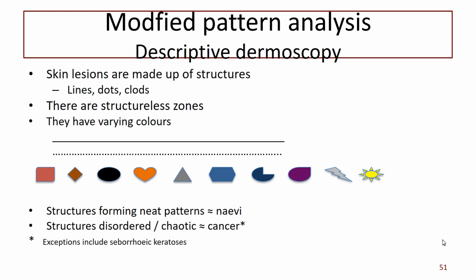So a lump of earth could be roundish, it could be elongated. Between the lights, so you mean this thing up here? We could say that's a clod, that's a white clod, yeah. We could call that sort of a clod, two clods on top of each other, and this is a clod. This is a bigger clod. Alice, do you see any circles? Around here? Okay, so a circle, I haven't got that on the list, I only said lines, dots and clods, but a circle is a line joined up. So this is a line joined up, makes a circle.